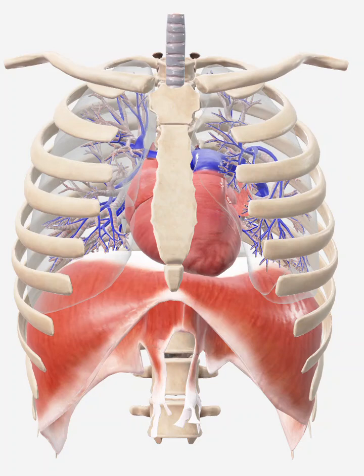All right, let's look at radiographic criteria of a chest x-ray. Whether it's an AP chest x-ray or a PA chest x-ray, we have to make sure that we've completely traversed the patient's body from the front to the back or from the back to the front. All right, so let's look at these.